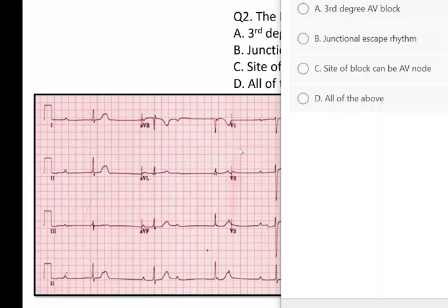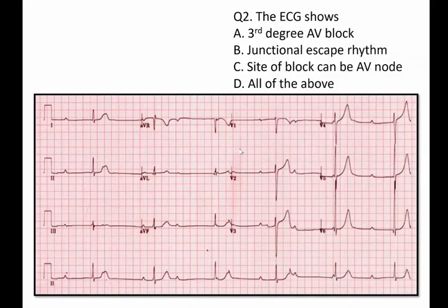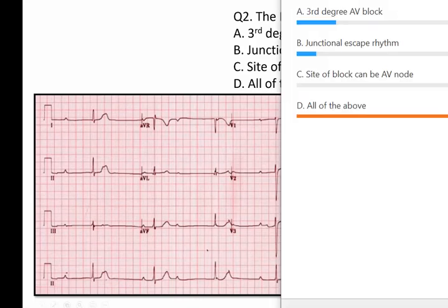So let's see the answers. The majority of you are right. The answer is all of the above. And so the ECG, let's go through this ECG.